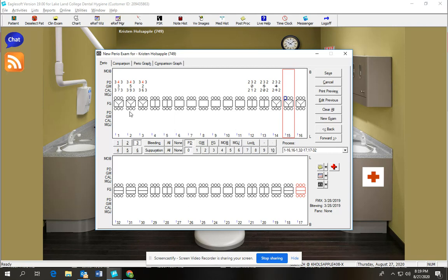If you look at these boxes, you are going to see 3 squares or 3 triangles, and 2 on the premolars, and then on the bottom you're going to see just 2 squares. Okay, and then the anteriors, you're not going to see anything. So with furcation involvement, that means it involves more than 1 root. Well, most anterior teeth just have 1 root. So all the teeth that have multiple roots can have furcation involvement.